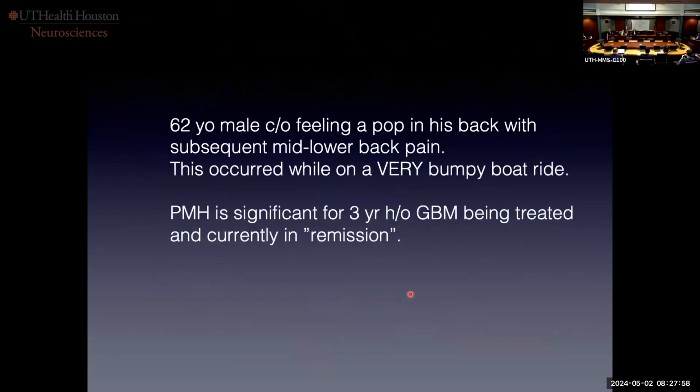So this is a case of Dr. Starks, a 62-year-old male, who felt a pop in his back and subsequent mid to lower back pain, and it occurred on a very bumpy boat ride. So I got the impression that he's in like a go-fast boat and he's really getting jostled around. He had a past medical history significant for a history of GBM, glioblastoma, being treated, currently in remission.